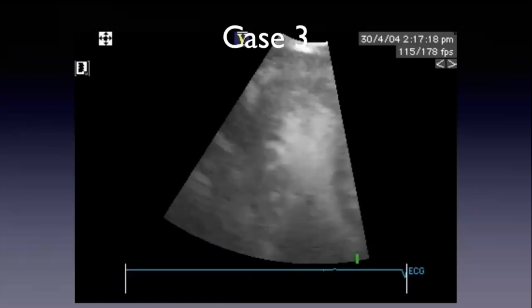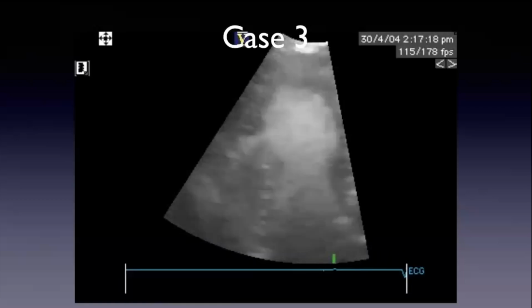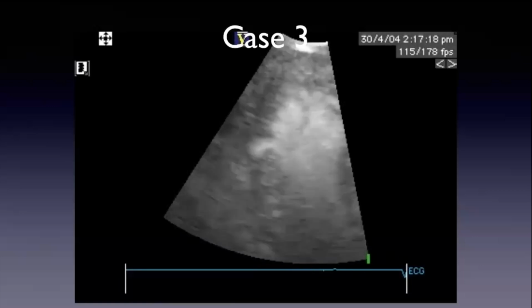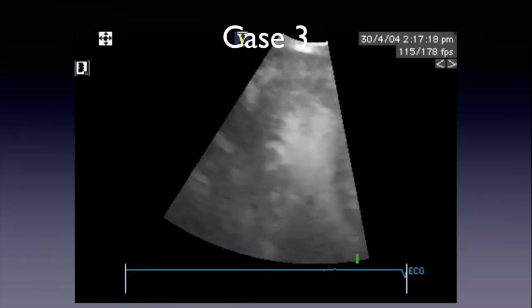What's atypical about it, Jamie? It looks almost too defined, in a specific spot. Yeah, you can imagine this is the tiniest transmural defect that you'll ever see. Literally, it's a fraction of the myocardium.